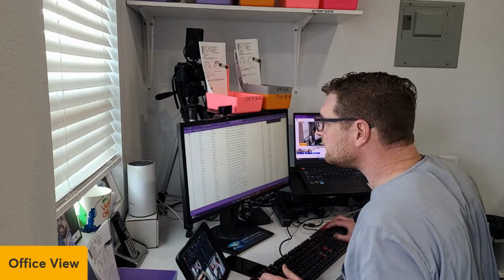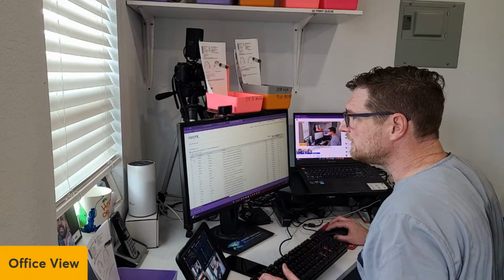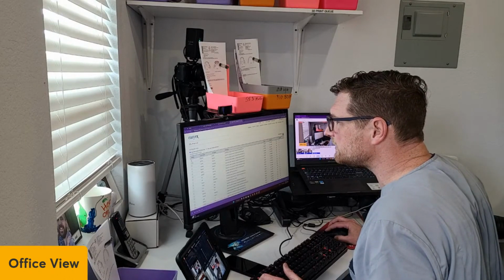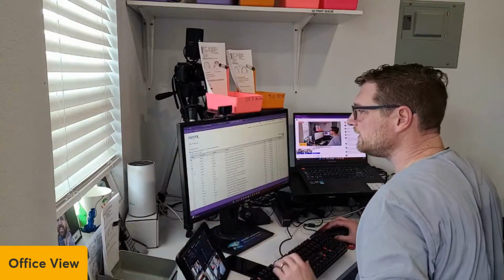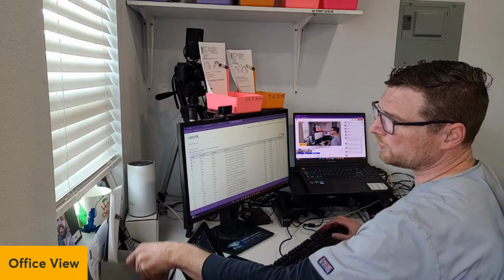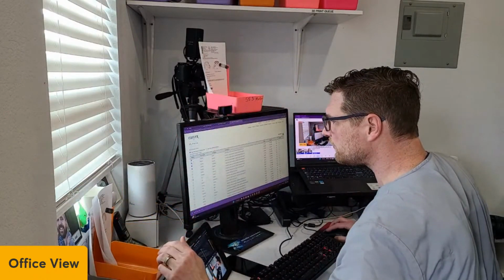It's not in here, so let me uncheck this. I've got to go back and find it in here. Here it is. Okay, so I accidentally left it checked. So check this one. There we go. All right, now we're rolling. And then get these two. All right, so that's 1, 2, 3, 4, and then the upper for this one.